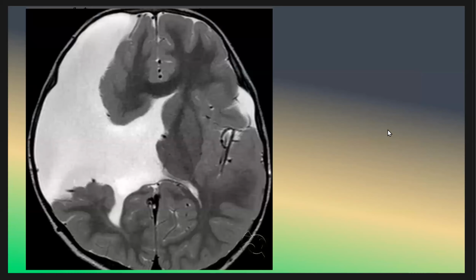We move to the next case. What do you think the patient has in the next case? We saw in some of the previous examples the closed lip schizencephaly, and here we have open lip schizencephaly. And as I said, this is lined by gray matter. If it is lined by white matter, this is not a schizencephaly; this is a porencephalic cyst. So this is lined by gray matter. This is open lip schizencephaly.